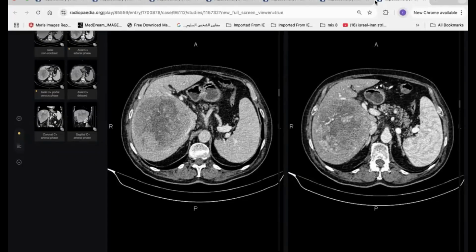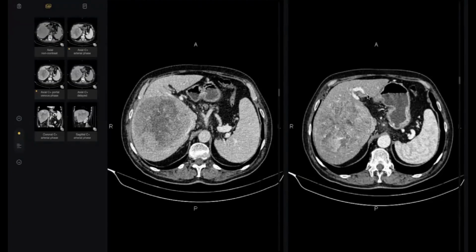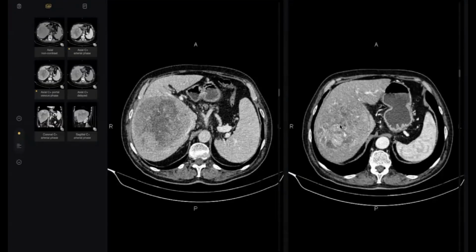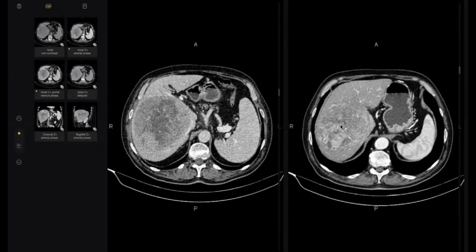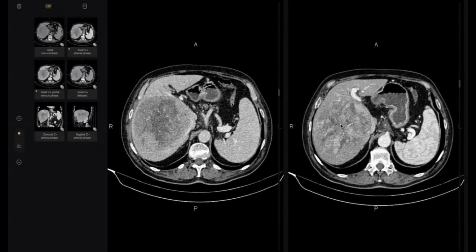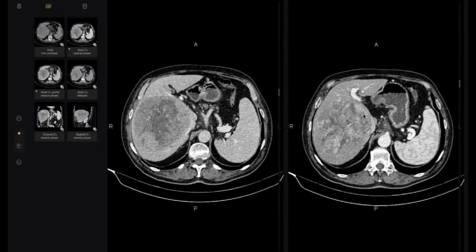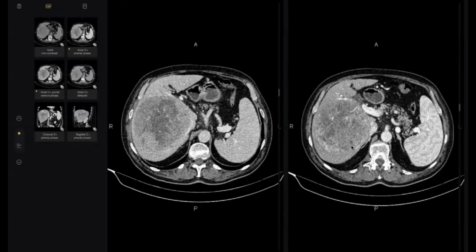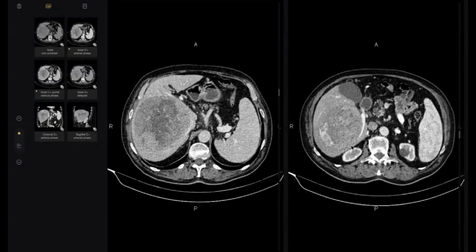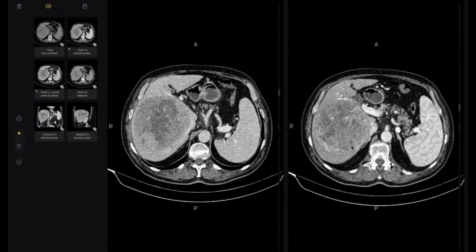Doctor, can you listen to me? Exactly, I don't know the name. Okay, this is mosaic type of contrast uptake, or nodule within nodules. This is a big lesion containing different nodules of different pathologies, and this is very characteristic for some hepatic lesion. Okay, you can continue your description.